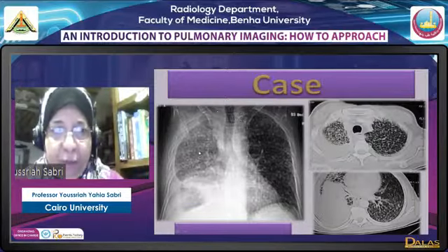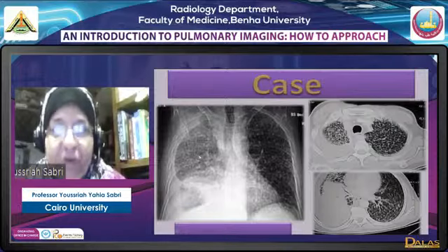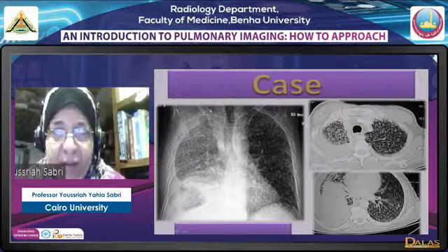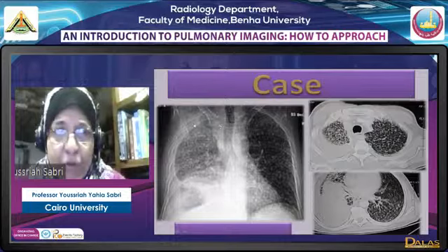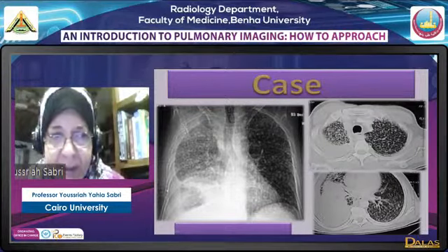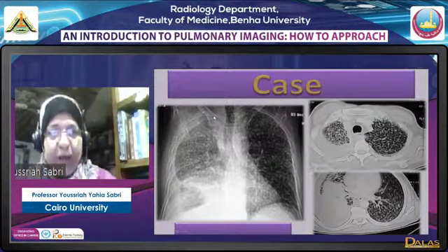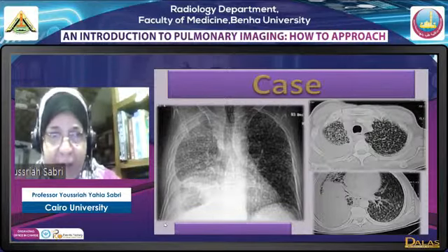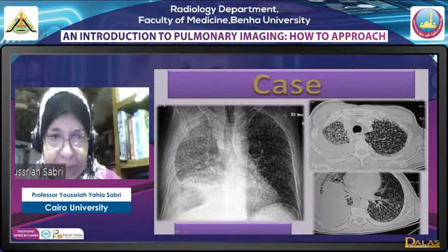Number one, if you compare both lungs, you will find veiling in the right lung because of the effusion. This is number one. There will be diffuse veiling, and then there will be pleural capping here. This is the apex here. There is a pleural capping here, okay? Because the water gathers in the most dependent part, which is the apex, and then it extends onto the lateral aspect and then basally. So we will have opacification apically, laterally, and basally, okay, in addition to the veiling. This is how effusion is seen in a supine film.